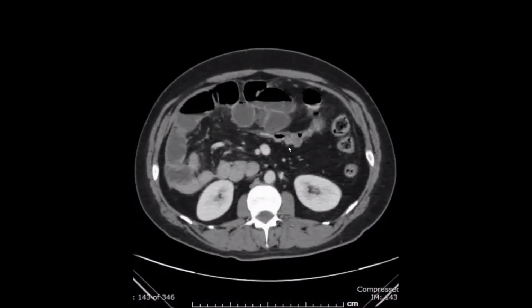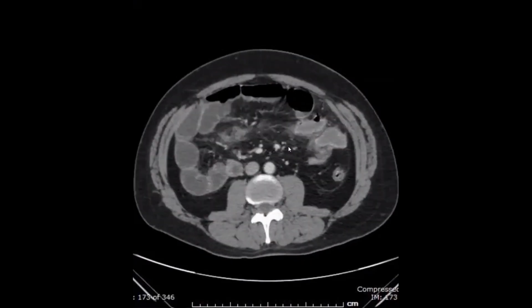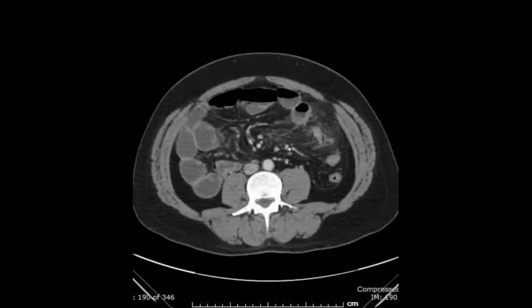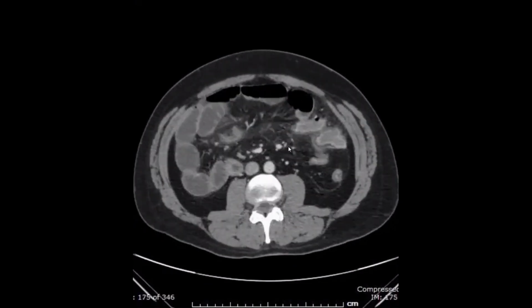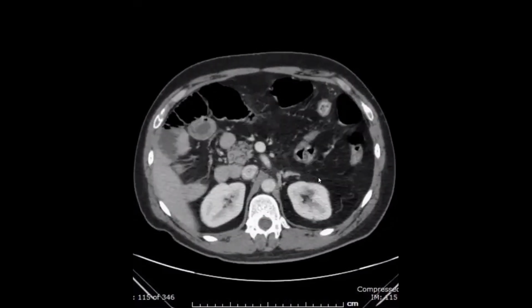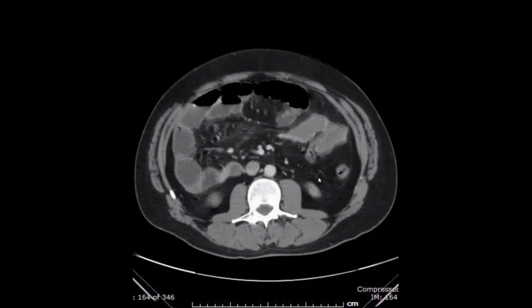The tough point here is to check the anatomy first. Once you check the anatomy, you will easily find the diagnosis. I saw it only once in my life. It's not a very common case, but once you identify the anatomy, you can find it. Especially in the exam or FRCR exam, you will find many examples like this one.